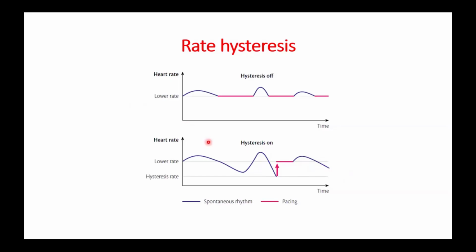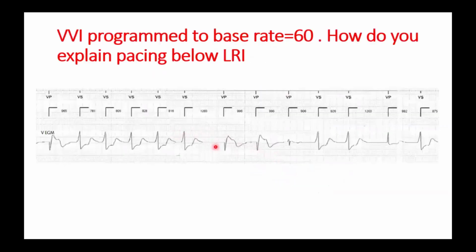In some devices, it can allow for pacing at a programmable number of cycles before returning to the lower rate interval. So this is a well-functioning pacemaker with hysteresis turned on.